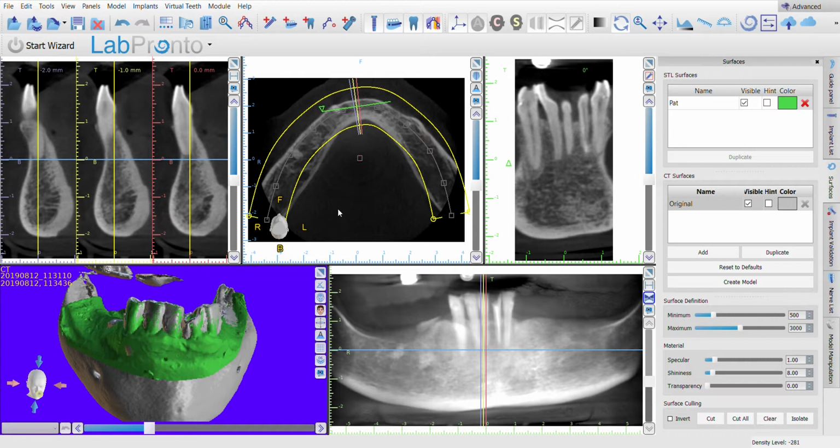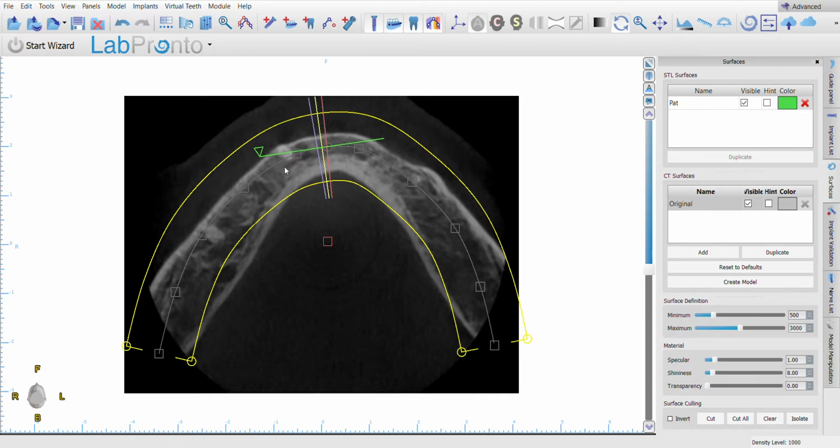The first thing I do, generally speaking, is that the program tries to map your jaw, and by mapping it means that you could see these slices. You could see these outlines running on your jaw, and it's trying to do the best it can in order for you to be able to see all the slices properly.